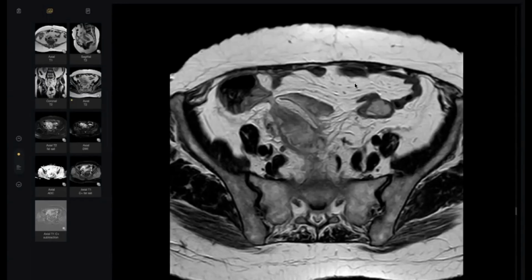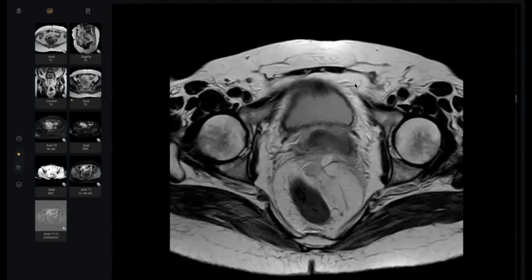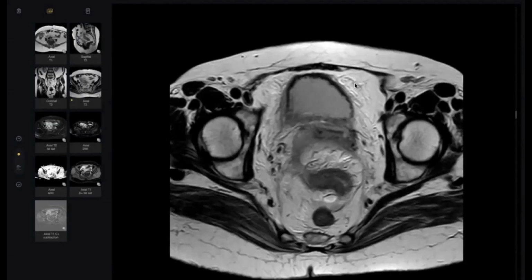In the early years of my specialty, I saw a young girl, 14 years old, with a large pelvic abscess, and they were wondering about the origin. I told them, did you check the appendix? Let's check the appendix. There was no appendix at all. This was a ruptured appendix, with a huge abscess in the pelvis.